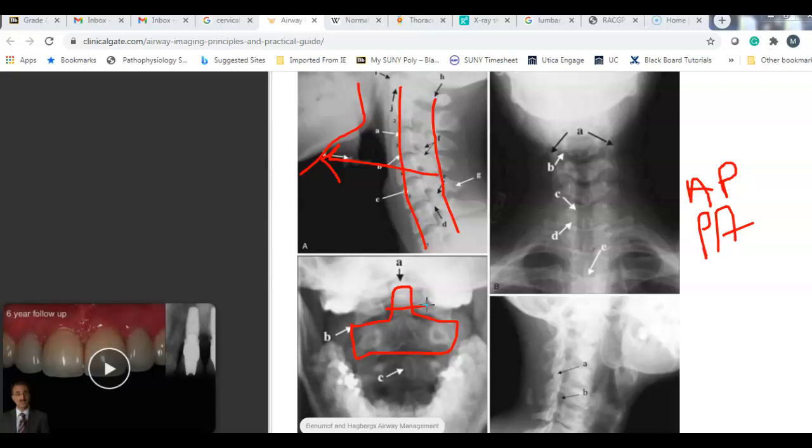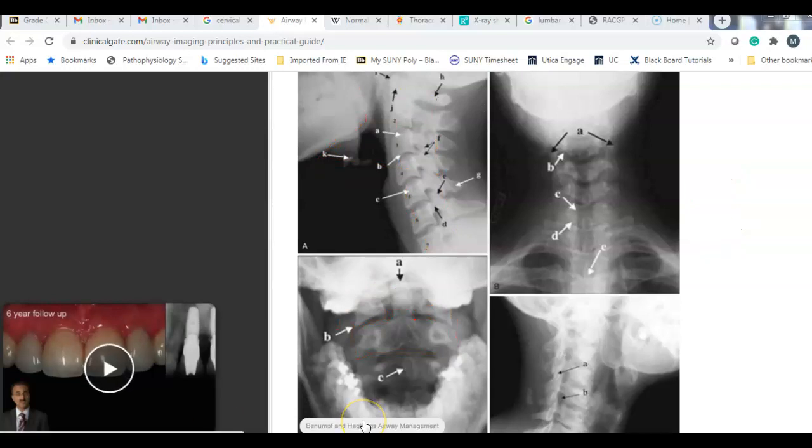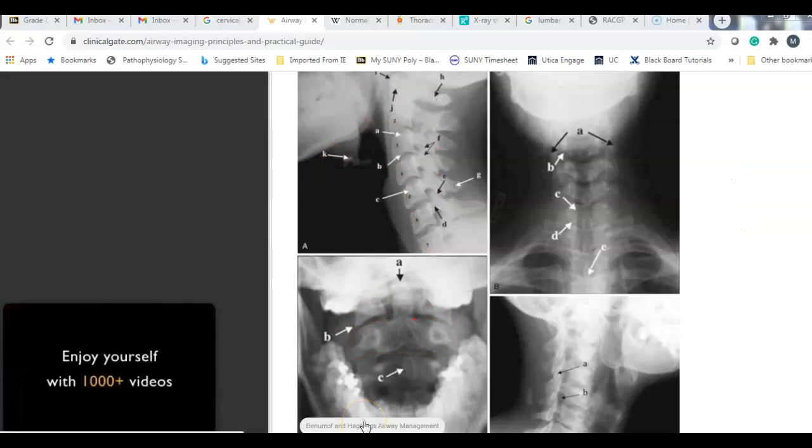Okay, so if you take an x-ray with the mouth open, you can see C1, sitting right around C2, and the dens, you have to look the anatomy of that up, sits right up into C1. Well, if you fracture during a severe acceleration, deceleration accident, you can fracture that dens right off. You can also take a look at that dens with patients who have, say, rheumatoid.